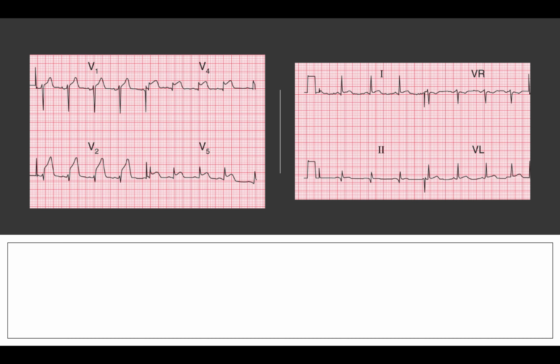Now, what about lead 1? Does the person have a regular heart rhythm? What is the heart rate like? The heart rate can be measured by 1, 2, 3, 3.5 boxes, which means clearly this patient is tachycardic. You can also confirm this by looking at the QRS complexes: 1, nearly 2 boxes, it should be 3, so this person is tachycardic. Does this person have a sinus rhythm? Yes, there is a P wave preceding everything. Are there any pathological Q waves representing old myocardial infarction? No, not really.